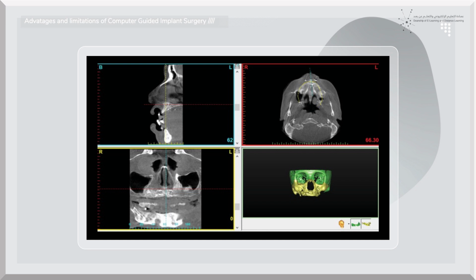One of the questions that can arise here is why the old guide would not be used. Actually, as all of us know, bone remodeling is unpredictable. So it is important to base implant placement on a new guide that is constructed from a new CBCT of the patient after healing. And in this case, we waited 6 months before placing implants.